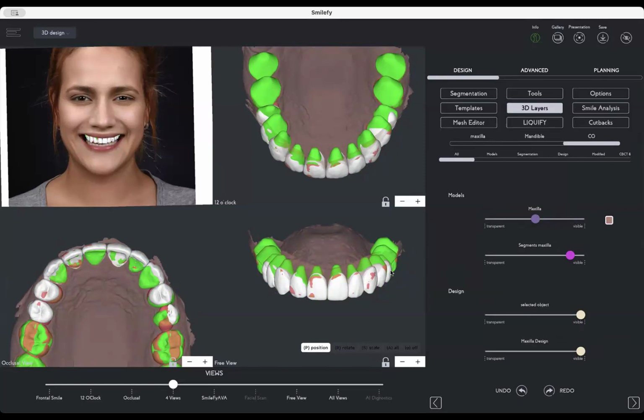We need an ortho treatment to realign the teeth properly, minimal invasive preparation, and then creating the ceramics for your new smile design, in which we will correct the gaps, we will correct the form, the incisal edges, and so on. That's the ideal design, in which you see the areas that needs to be prepped.